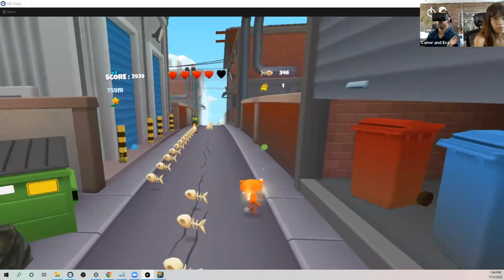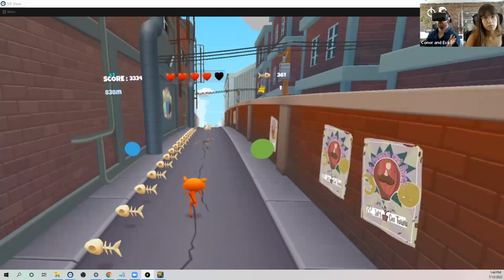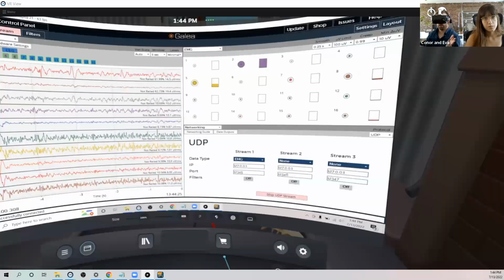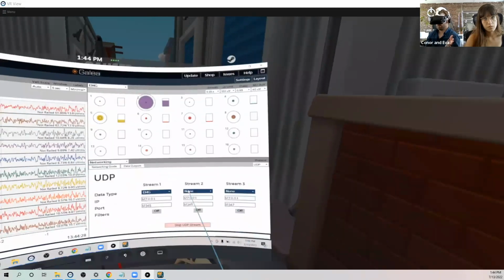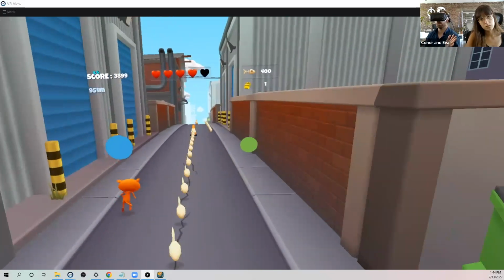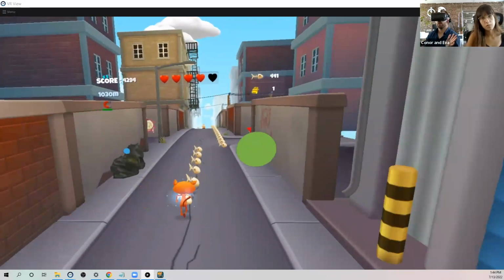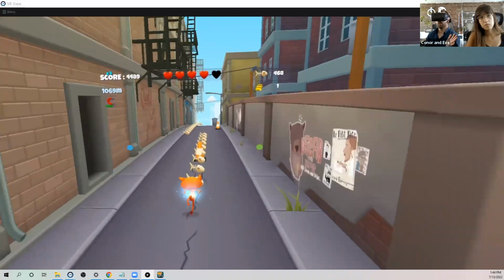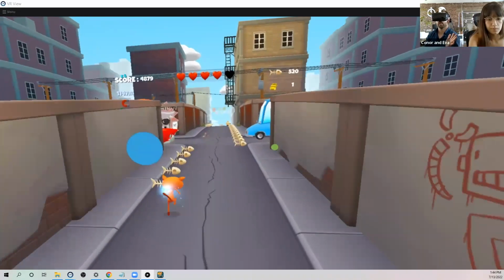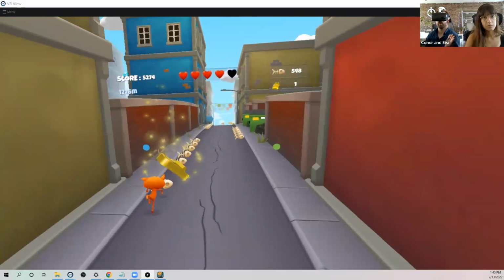If I'm talking while I do the demo, you're probably going to see a lot of accidental activations, because the system is picking up me talking and thinking that it's intentional EMG activation. So if I go back and make it a little harder, let's put that back to 40, I should now be able to talk pretty reliably without tripping the switch. But that means my intentional activation has to be that much stronger, or the signal has to be that much better. The implications of this are pretty profound for individuals with motor disabilities. I think this has a lot of value that it can already add in a medical context, to individuals who have motor impairment.